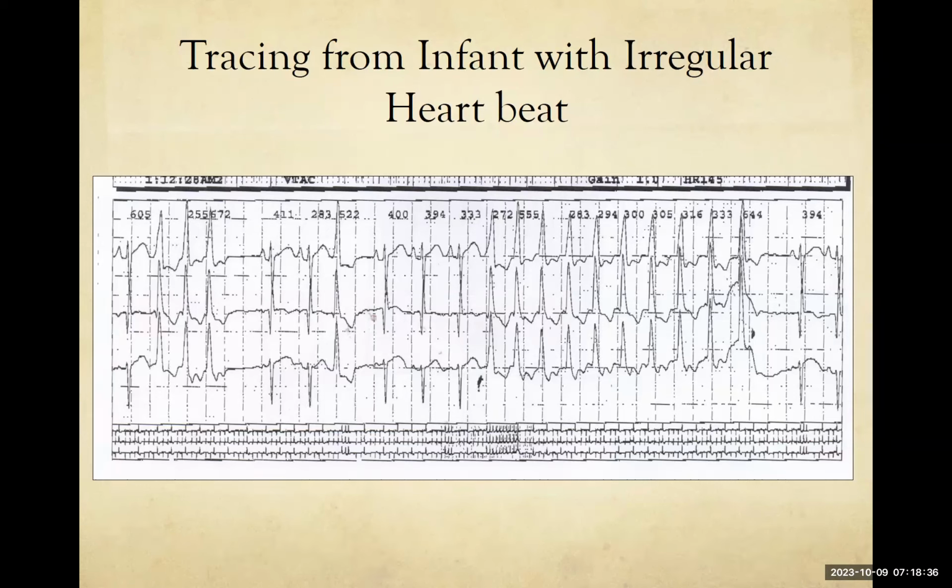So there is no hard and fast rule about this, but what I would say is we would observe this and observe the frequency, the rates, and then determine how we might want to treat this, if we need to treat it at all. In other words, if this panel was the only panel of a 24 or 48-hour period, and everything else was just occasional single PVCs, I might be inclined to observe and not treat.